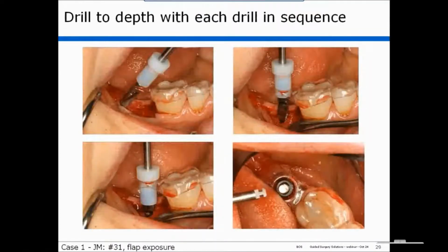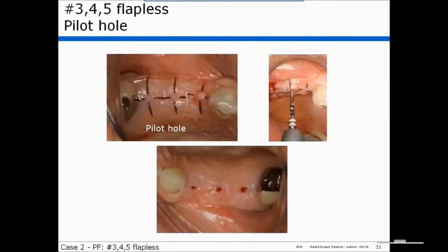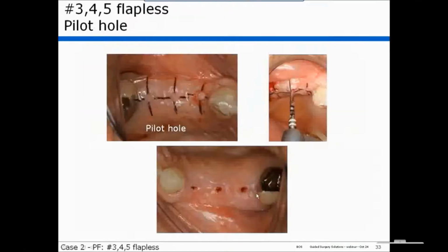Okay. Another question that came in is if you could explain how the surgical guide allows flexibility to modify the surgical plan at the time of surgery. Yes. In this system, let me go back to here. Let's say your entry point, when you open this case, well, this is a closed case, but let's say the entry point is off and you want to move it a millimeter, half a millimeter, one way or the other. What you do is you look at your scan and you see if you do that, how does that affect the trajectory? And you can make an alteration either only in the entry point, or sometimes you can make an alteration in the guide hole.